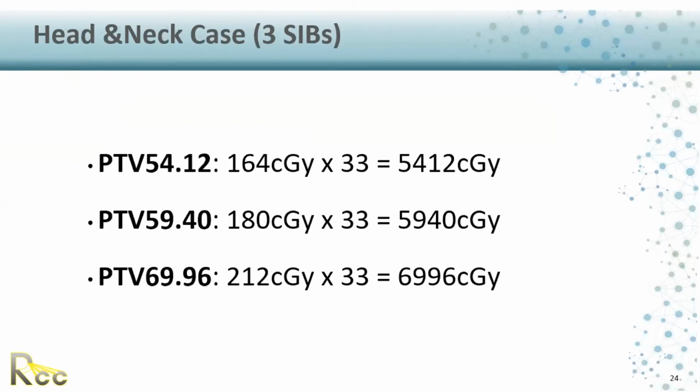Sure. How does the 4 gray per millimeter gradient that you're looking for impact the MU number and your plan complexity, and how do you evaluate that plan as a physicist? Also an excellent question. Yes, it will increase your MUs for sure. If you put more burden on your optimizer, this will increase your MUs, but not significantly. Let's say if you have 600 monitor units, it will reach 640, 650, something like this, sometimes 700. So it will be like 10% of your MUs.